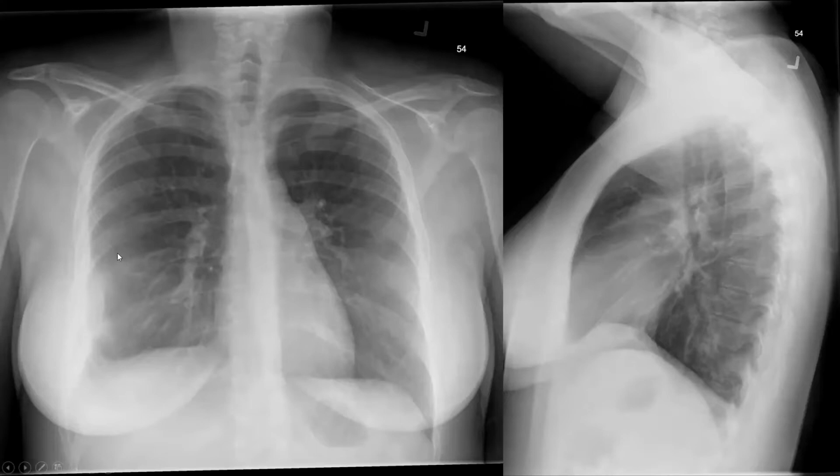Okay, good. So this chest x-ray might be a little deceiving because you don't really see anything in the lung fields, and that's where our eyes always want to go. But what she has here is this subtle finding of blunting of her right costophrenic angle. And then this little thing that kind of sticks out right here, that is something I would read as probable pleural thickening or perhaps a very small loculated effusion.